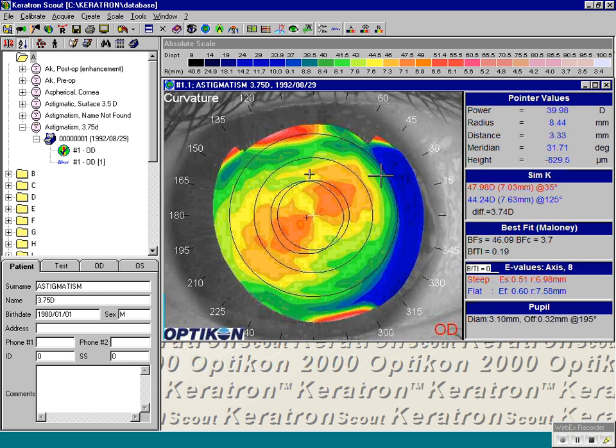And if we look at this cornea, we would say, well, it looks rather irregular, but in reality it is not. It is astigmatism, but it is quite regular astigmatism, and the shape is highly regular. Although astigmatism optically is not good, physically and shape-wise, the shape is very, very regular. The higher the number, the more irregular the cornea. For instance, an offset cone would read on the order of 4 point some numeral.